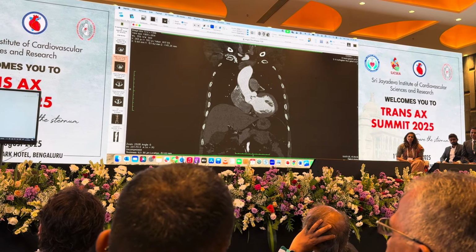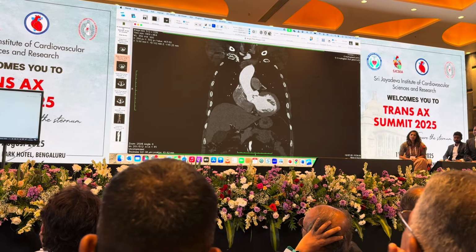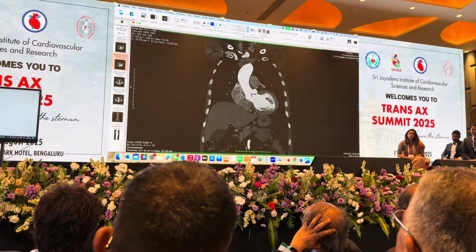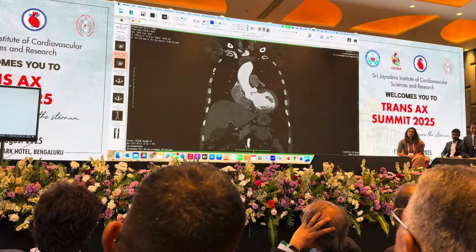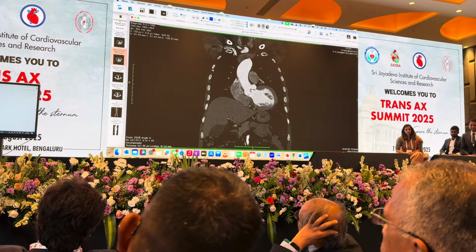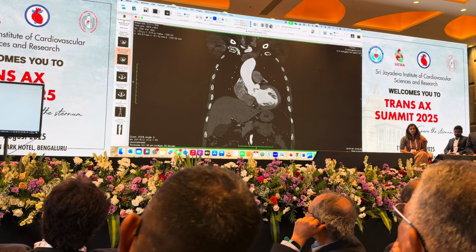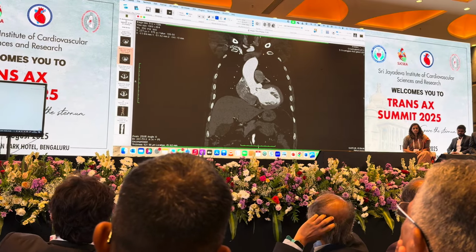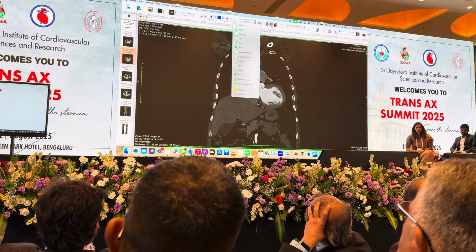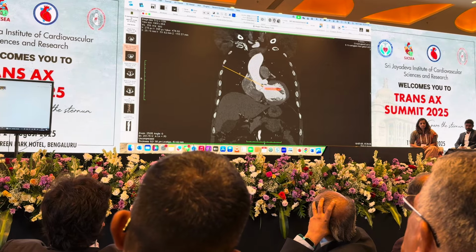Of course, forget about all the calcification of the aorta, the groin vessels, the size, the quality. I'm talking about where to enter the chest. So this is the first intercostal space, this is the second, this is the third. What I want is to be close and perpendicular to the aortic valve. So what I see here, this patient has a reasonable intercostal space, the width of the intercostal space, and the distance from the chest wall to the aortic valve, that in this patient is 12.